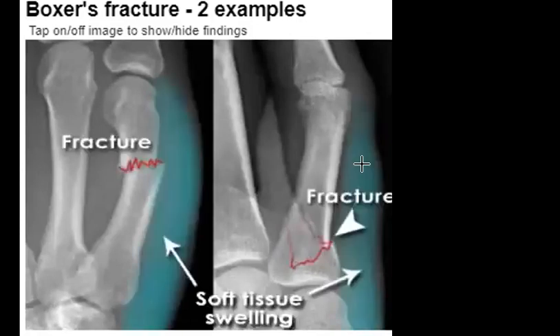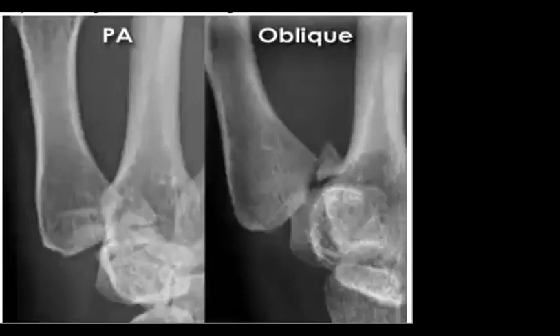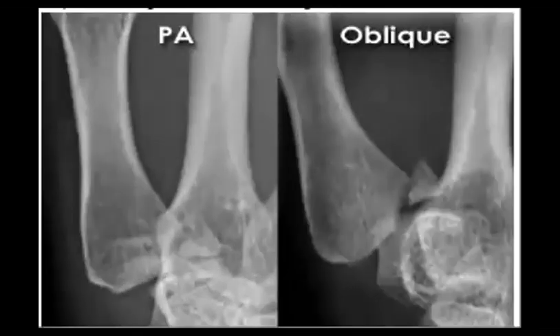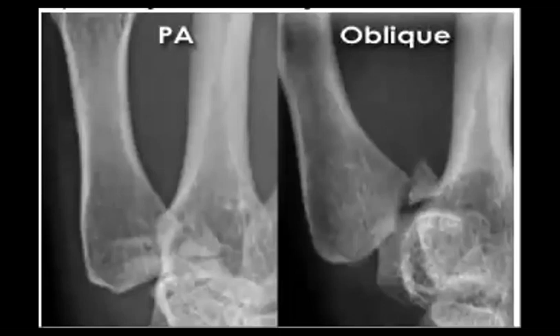And it's good also to check the soft tissue. So look at the soft tissue on both sides, which gives you a clue that the fracture is here. So when you have a fracture here and it is reaching the intra-articular surface, then you can call it. It's important to check if there is any extension to the intra-articular side or not.